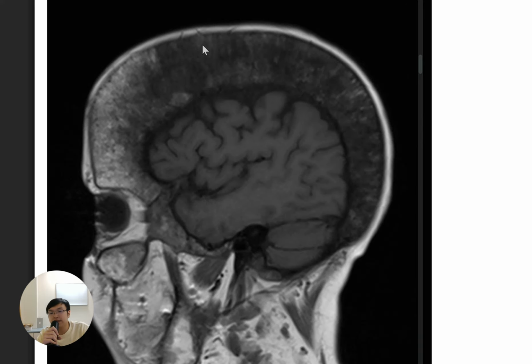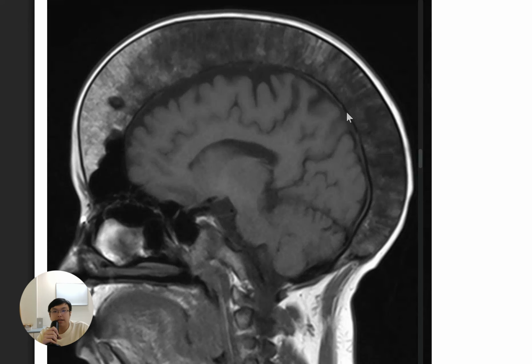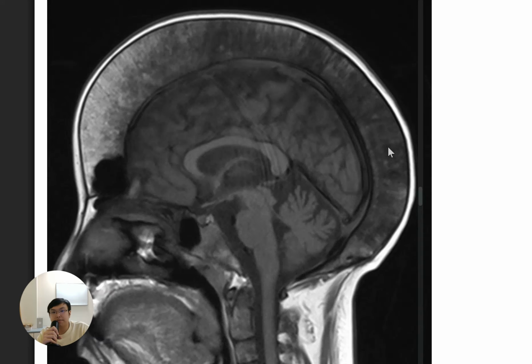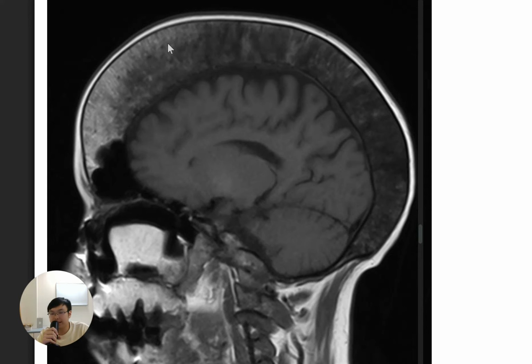But they're still interspersed fat in between those hematopoietic components. So basically they are hyperplastic marrow, especially hematopoietic components, in order to produce more red blood cells in chronic anemia. Why do we know that it is chronic anemia? Because all this hyperplasia takes time.